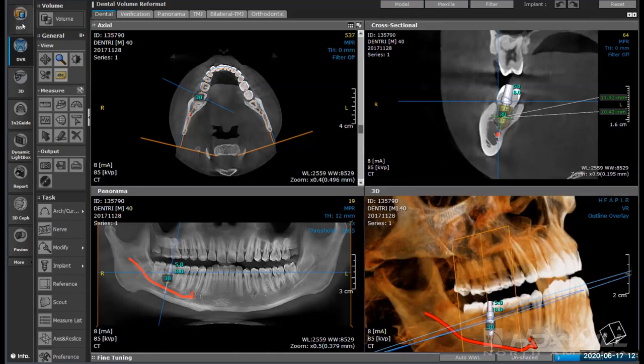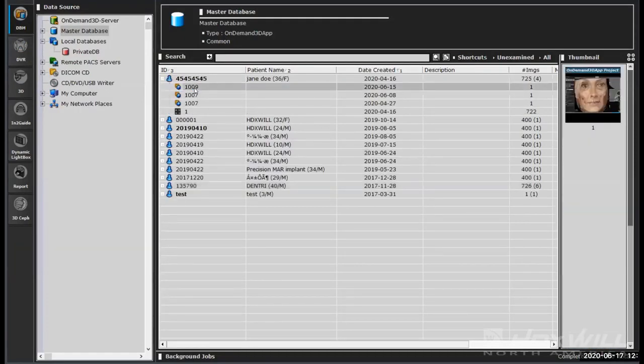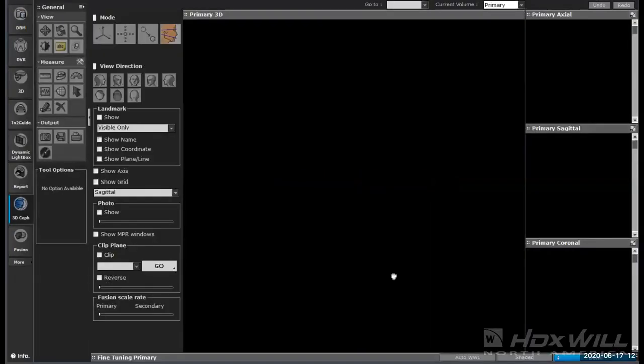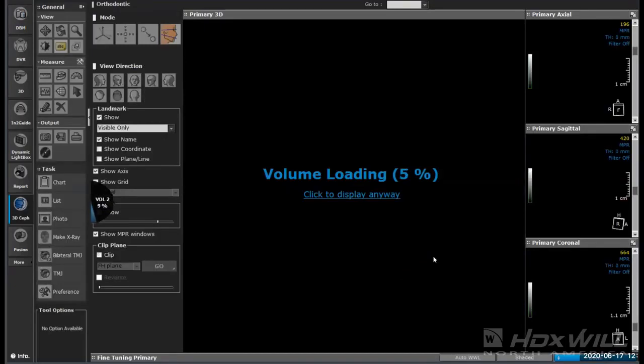So I'm going to just pull up an example of one where we've actually added the STLs into place. Sorry about the loading. I think everything gets a little lagged as we do the Zoom meeting. But again, it allows us to take that information. So in this case, we had a willing victim to do a scan and examine.